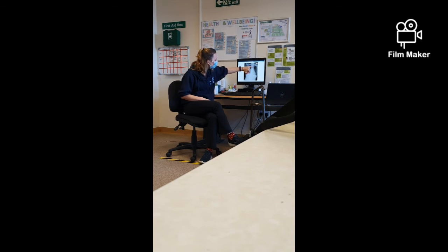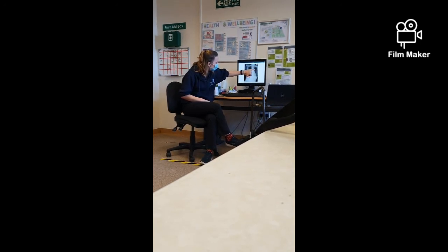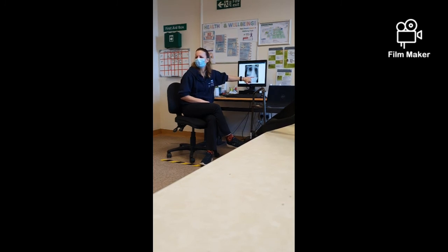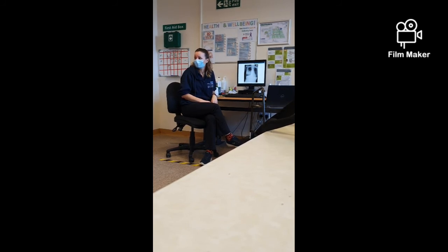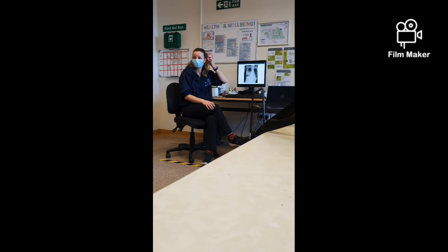Okay. And also, if you can see carefully, there's a line going down here. Oh, can you see that? Yeah. So what's that most likely going to be? If you think about the poorly from a chest point of view, what might they be on when they've had this chest X-ray taken? Oxygen, yeah, so it could be oxygen tubing, nasal cannula, something like that.